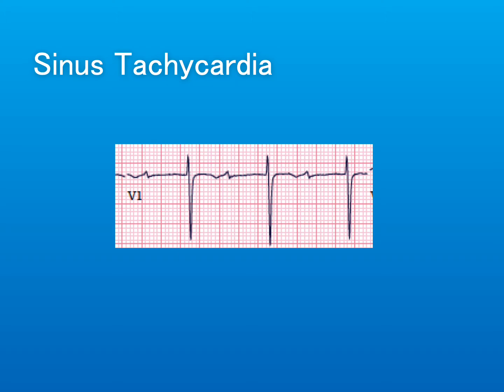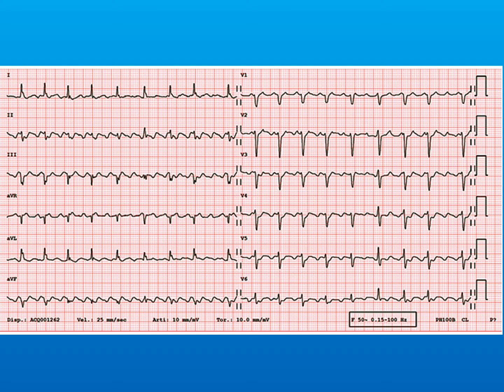So number 2 is atrial flutter with 2-to-1 conduction. So this is an arrhythmia that's often missed. It's caused by a re-entry mechanism within the atria, and what we're going to see on the ECG are flutter waves or F waves that create a sawtooth pattern. The most reliable leads for F waves are V1 and sometimes V2. Sometimes they can actually be superimposed on the T waves, so it can be quite difficult to tell what's an F wave, what's a T wave.